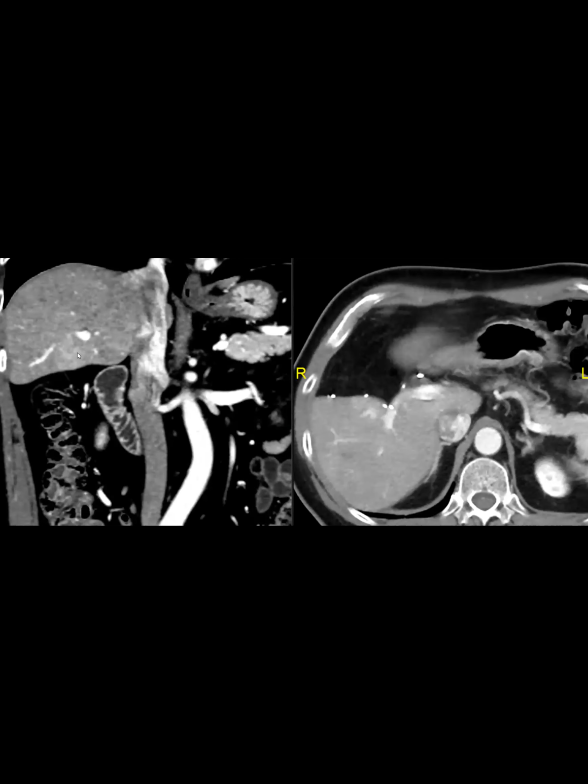So she's saying that they both fall under corona. Oh, interesting. Even though corona means crown, so it should be circular around it. I guess the name is a little vague. Right, clarification for the next update. No, there is perilesional enhancement in arterial phase. So that's kind of the topic of corona.